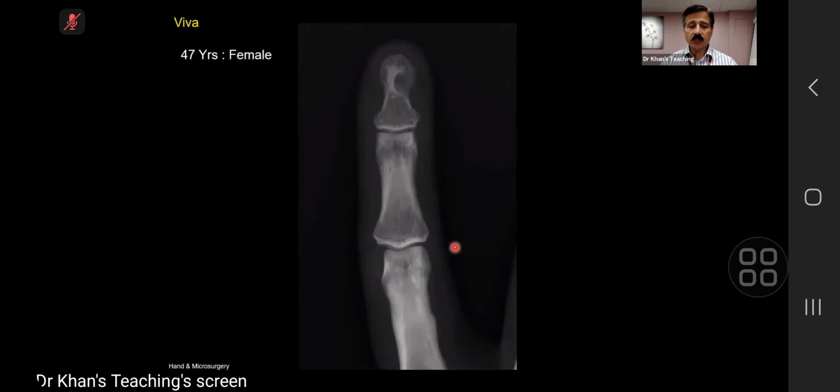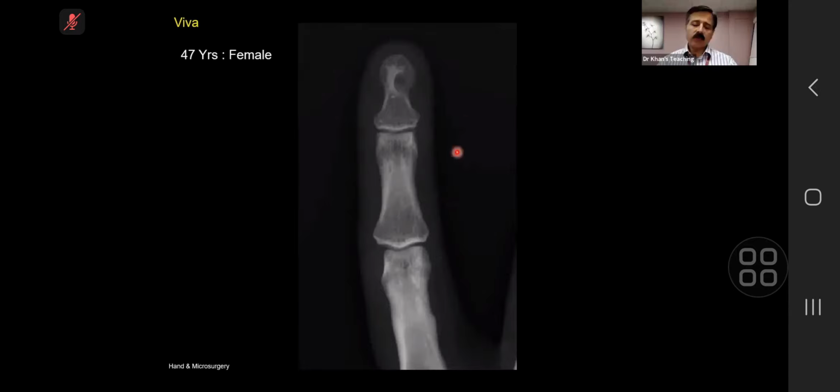It's highly unlikely to be enchondroma. There's no expansile lesion here. So out of glomus tumor versus an implantation epidermoid, which is it? Glomus tumor is my choice. Why? It's showing a bit of scalloping, and there's sclerosis around the lesion. Okay, well done. Okay, we stop here.